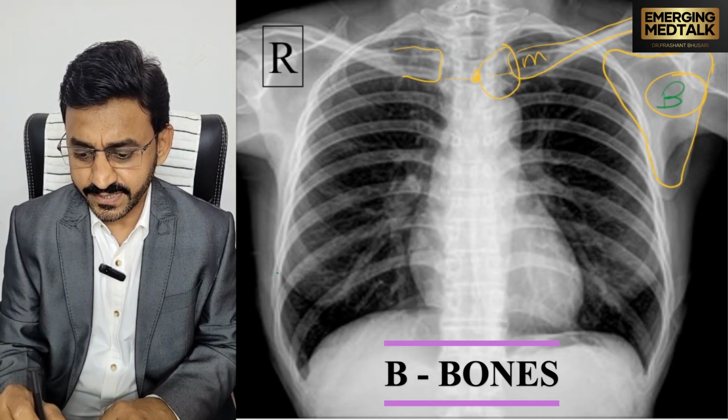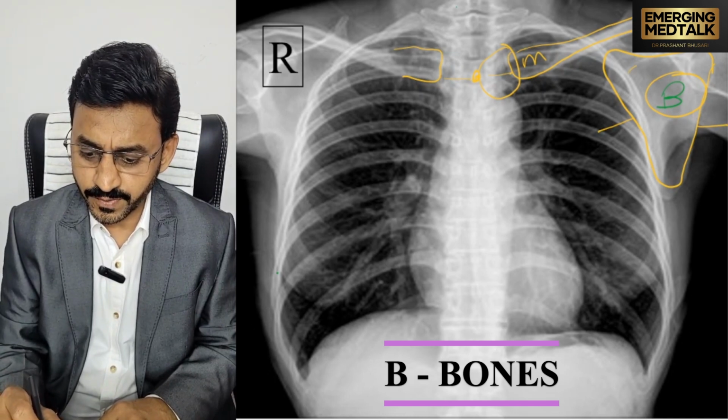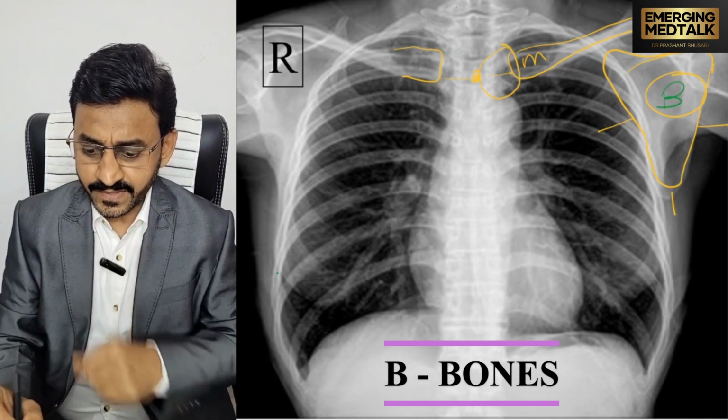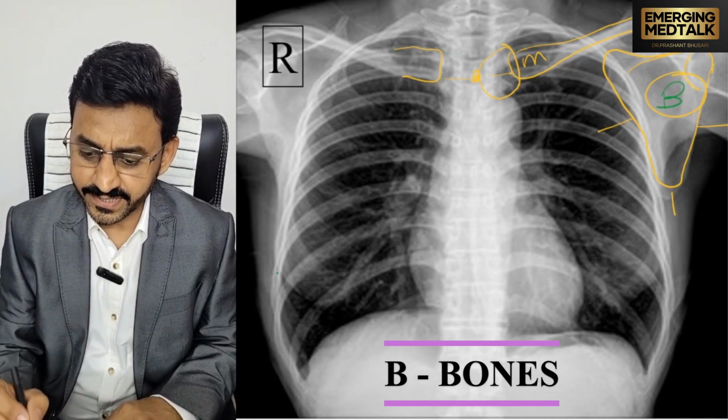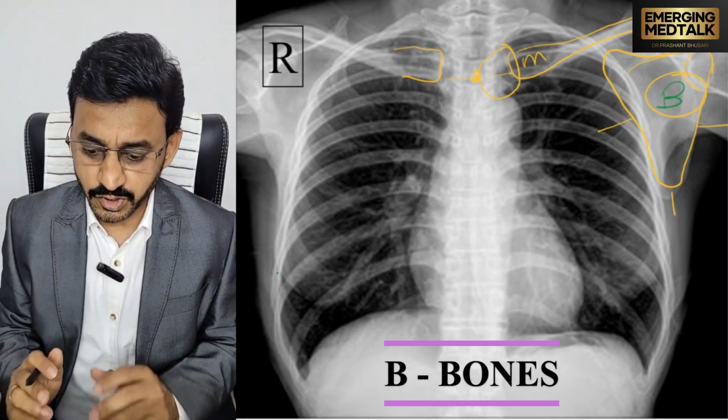Then next we will discuss the shoulder blade, that is the scapula. Here we have the medial border, lateral border, and superior border. Here is the spinous process. Here is the inferior angle, then the superior angle, and laterally the glenoid cavity, which articulates with the head of the humerus to form the shoulder joint.